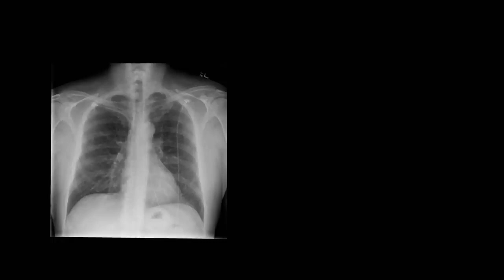I'll review these parts in Lesson 2, but before then, there are two quick practical things to point out first. It may have happened so fast that you did not notice it, but when I removed the film from the detector stand, I flipped it around horizontally. The consequence of this is that the left side of the film, as we are looking at it, actually corresponds to the right side of the patient, and vice versa. This puts the X-ray in the same orientation as if we were standing in front of the patient and looking directly at him or her.